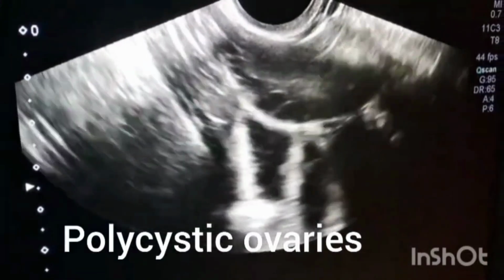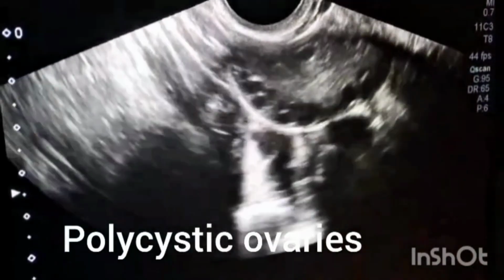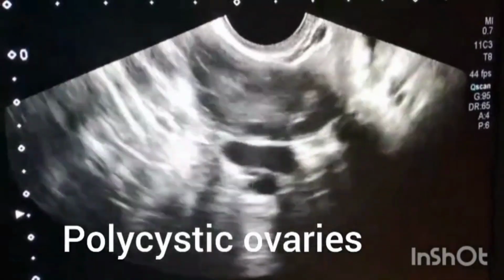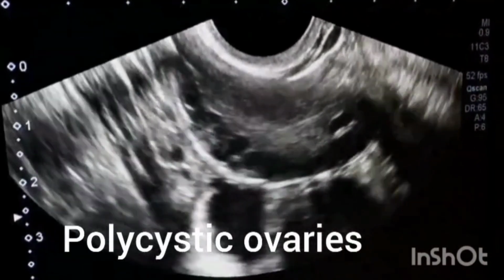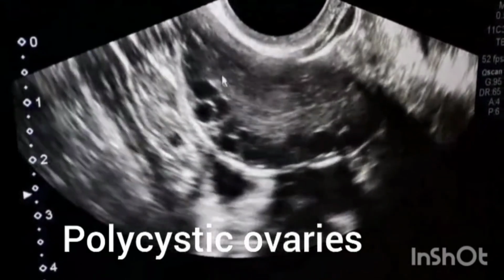Another number related to 10 is that more than 10 follicles are present on a single view, and the other 10 is that all the follicles should be less than 10 millimeter in diameter. It can also be called the rule of 10.